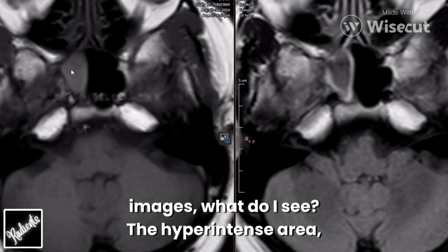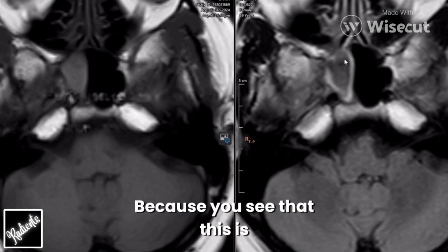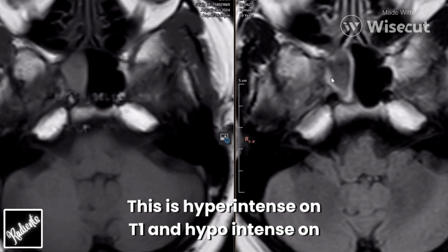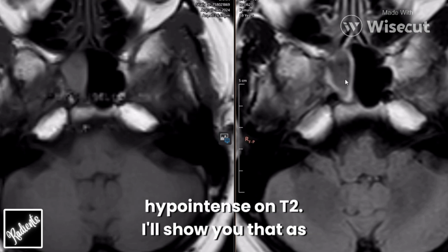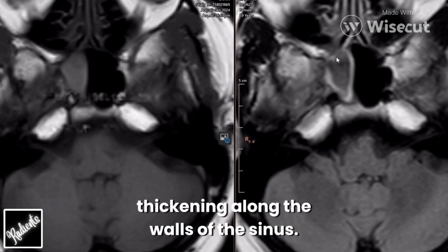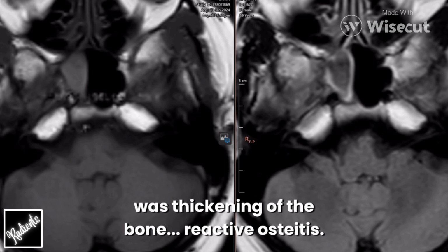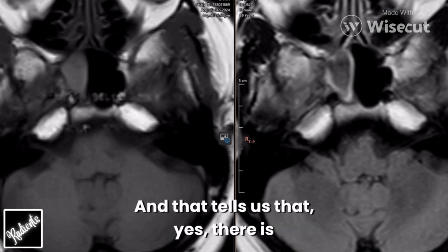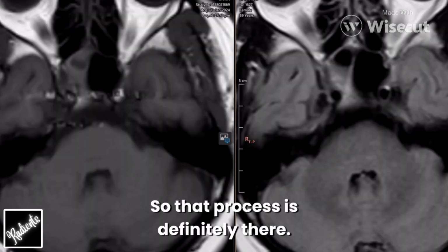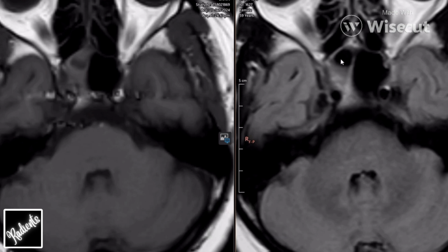The hyperintense area, which I think could be chronic secretion, is pretty much what I am expecting, because you see that this is hyperintense on T1 and hypointense on T2 FLAIR image. It will also be hypointense on T2. I'll show you that as well. And along with that, you can see on this FLAIR image there is mucosal thickening along the walls of the sinus. And in CT scan also we could see that there was thickening of the bone, reactive osteitis, and that tells us that yes, there is definitely some chronic sinusitis kind of process going on. So that process is definitely there, but along with that, you can also see here the cause of the fungal sinusitis, the chronic sinusitis that is happening.